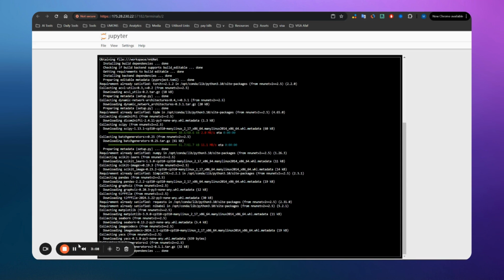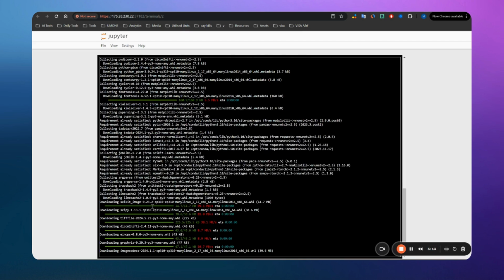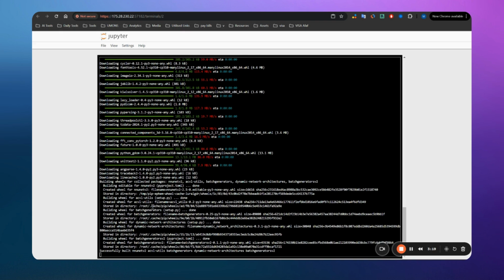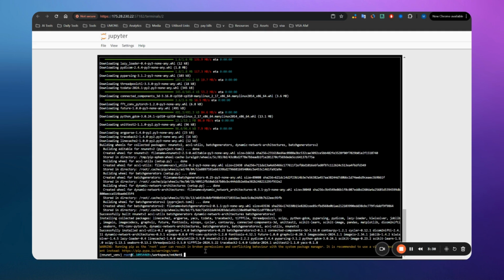Let me just move this. Okay, just a few seconds. All right, so it is done. Let me just clear and cd here. Okay, now we have installed nnUNet.